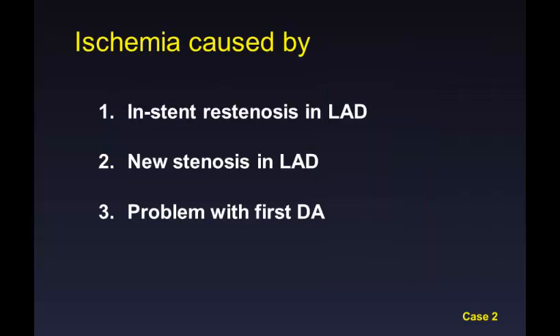My question now, what do you think now is the ischemia caused by? Is it in-stent restenosis in the LAD? Is it a new stenosis in the LAD? Or is it a problem with the first diagonal? Please vote.